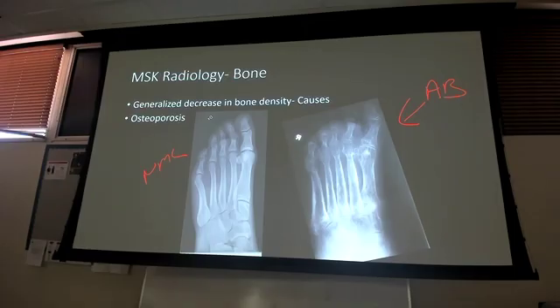So sometimes they may have shot it in a direction or in a way that the R was the other way, but then they've flipped it 180 so it looks like the way it's supposed to. So just know that's right or left, that won't really affect it, it's always going to look this way for you.